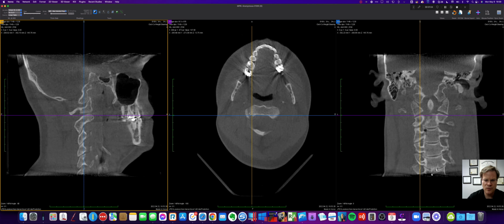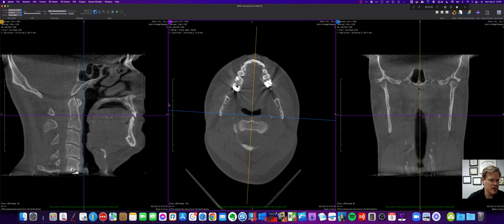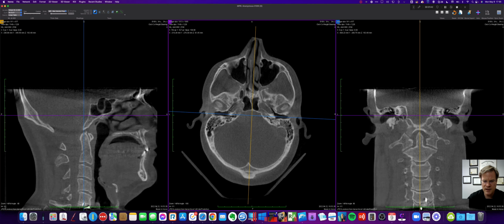Okay. Now what we need to do is center everything. So we use the ear canals for measurements because we can see those when we're looking at the x-rays. So let's go find the ear canals, and we're going to set things. Looks like I kind of got things good there. So we're going to look at the tilt, which with regular x-rays we look at the eyes. We don't always get the eyes. We would on this one. We could look at the eyes, but we might as well just use the ear canals. We're already using the ear canals.